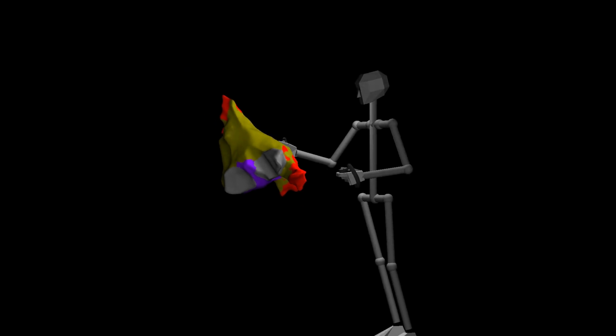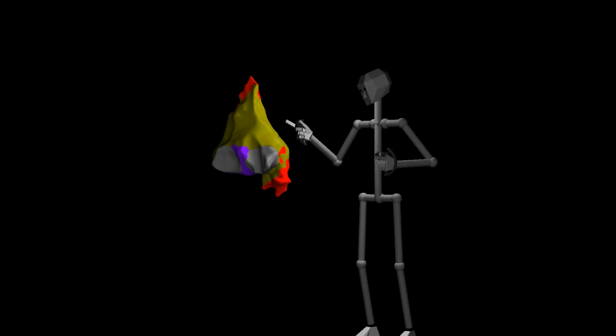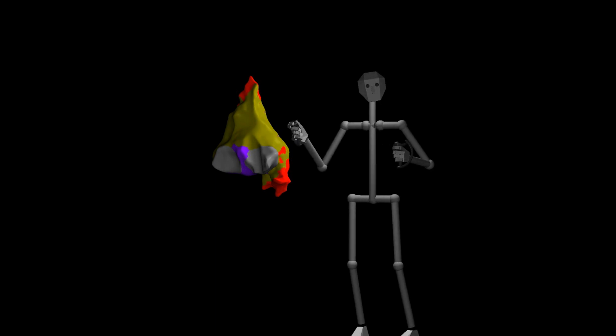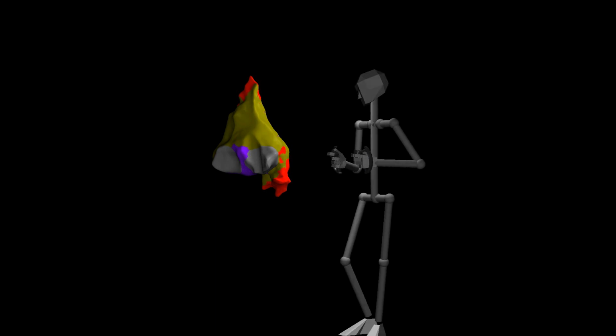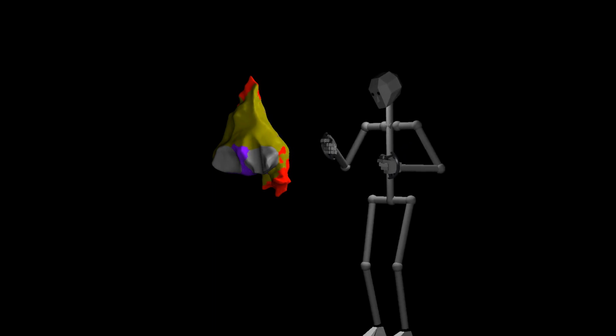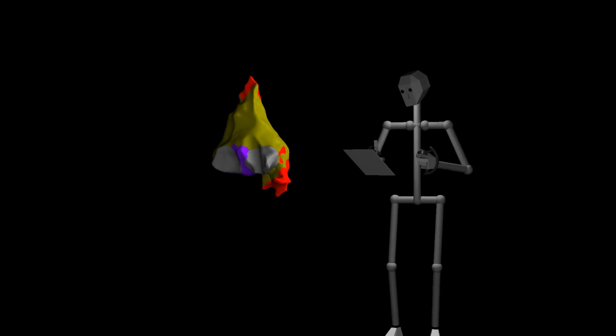The idea here now is that we can not only look at a single one of these surfaces, but in each of the procedures, at least two of these surfaces are collected. One of them is before the actual cryoablation procedure, and then there's going to be one or more after the cryoablation procedure. And this one here is the surface from before the procedure. So now I'm going to overlay that with the surface from after the procedure.